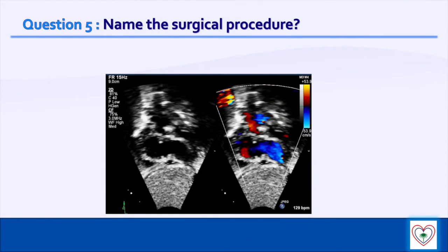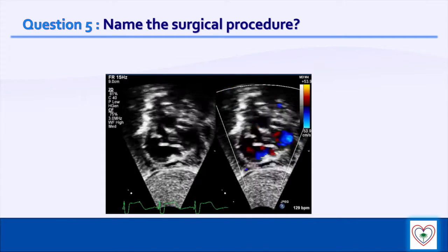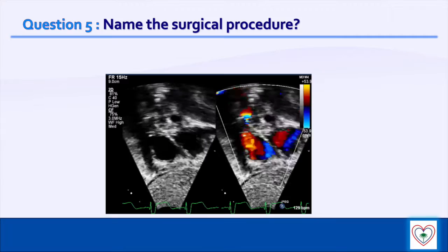This is the last echocardiographic case. I would like you to look carefully here and tell me what's the name of the surgical procedure done for this patient. So this is actually a long loop.